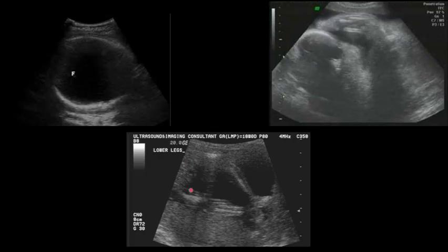Here we have a breech presentation. So we see two little butt cheeks and a little intragluteal cleft, and that represents the fetal behind, kind of sitting over the cervix, so this presentation would be breech. And then here we see a compound presentation, or we see what looks like probably a little foot right here. This is probably a butt cheek. And so anything that isn't very clearly head needs to be followed up. And that's a pretty easy finding. But this is a footling breech here. This is a frank breech, and this is cephalic.